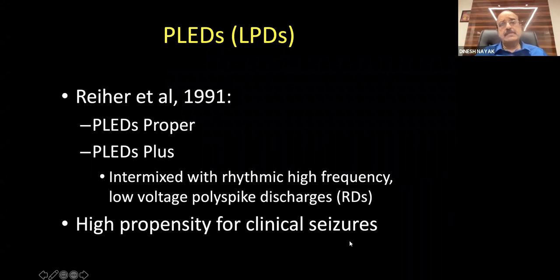So not all PLEDS need treatment. If somebody asks me, would you like to treat this EEG, I would say no, I wouldn't treat unless I see PLEDS plus. Because if I see PLEDS plus, then sooner or later the patient is going to have an epileptic seizure. So should I wait for the first seizure or should I treat immediately? I may treat immediately. So you have to recognize PLEDS plus. PLEDS proper, you probably don't have to treat; it is just a marker of an underlying injury.